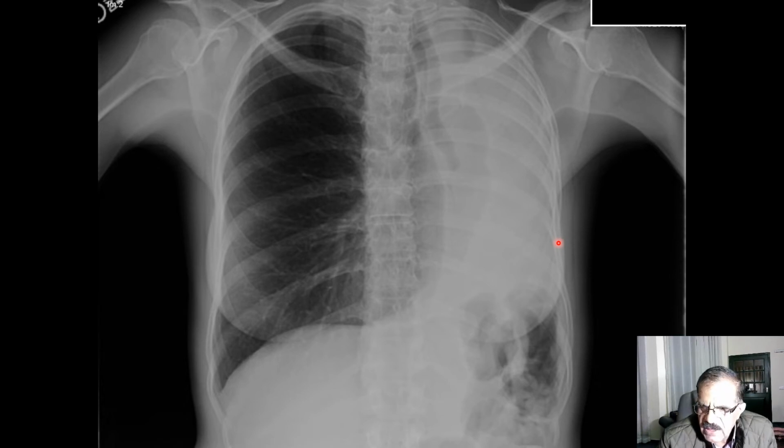After pneumonias, the second thing we would like to cover today is collapse. Why do I want to discuss collapse with pneumonias? Because collapse also affects specific lobes and it also produces similar homogeneous opacities. But there's a basic difference. In consolidation, I emphasize again and again that there's no loss of volume, there's no gain of volume.